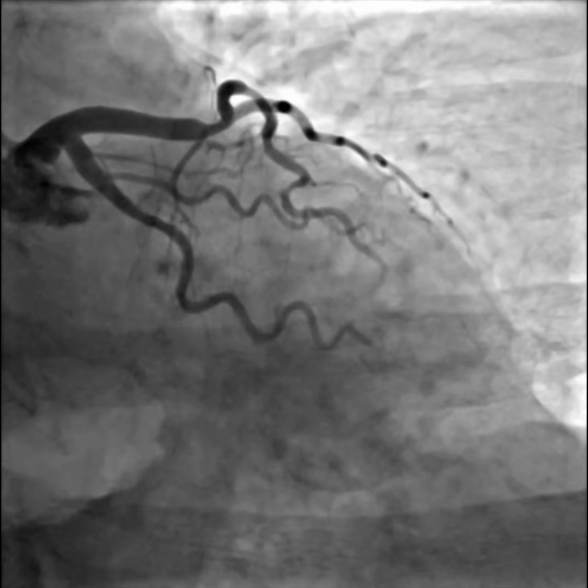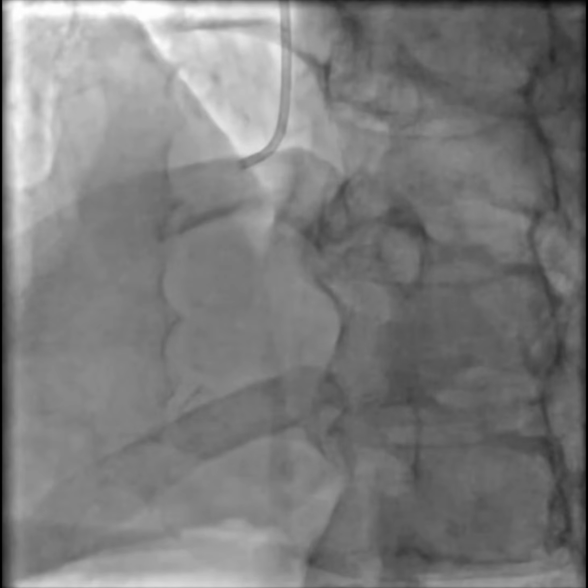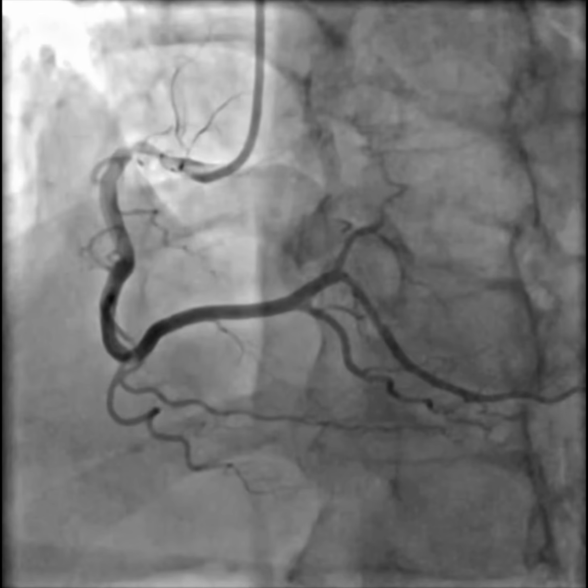And again, just for comparison, to show you one of the reasons you could suspect disease here is that on this shot of the RCA, you can see that it's a sizable vessel and it does give off a PDA system, but this posterolateral branch from the RCA is pretty unimpressive. It doesn't seem like it's enough to be perfusing that whole area that we saw on the inferolateral wall on the other views that didn't seem to be getting blood supply.